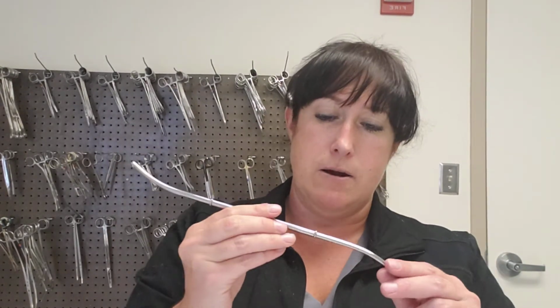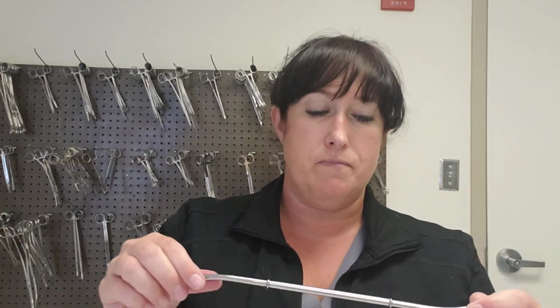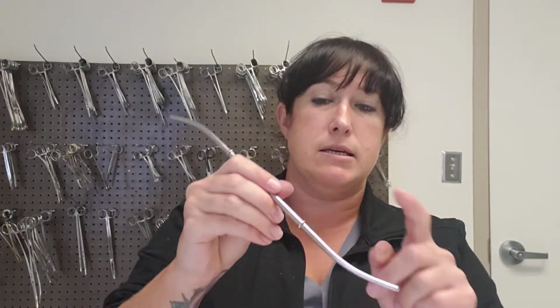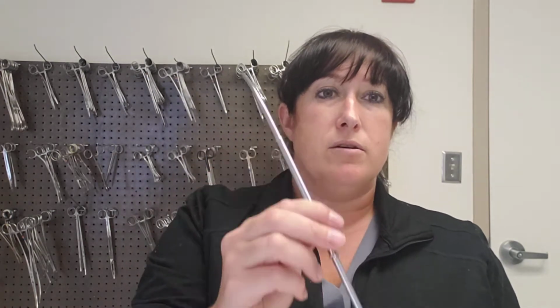Okay, so on here, there are these little tiny marks, and I don't think you're going to be able to see it on the camera, but in person you can. This says 11 right here. So I know that I'm going to say 11, and I'm going to communicate that with my surgeon and hand that to him or her. They'll use it, and more than likely they'll flip it around and stick the 12 in there and give it back to you. And then you'll do the 13, and you'll say 13, and then they'll do the other side 14, and so on until they tell you to stop.